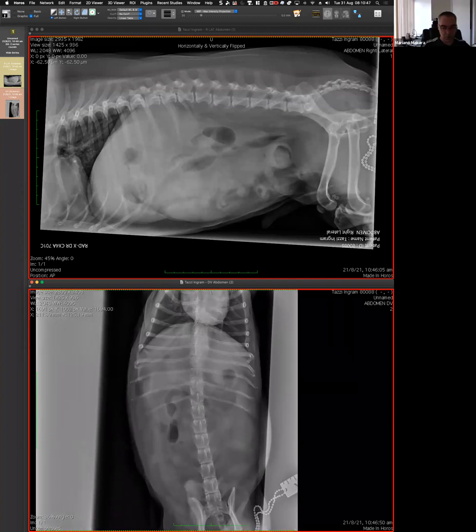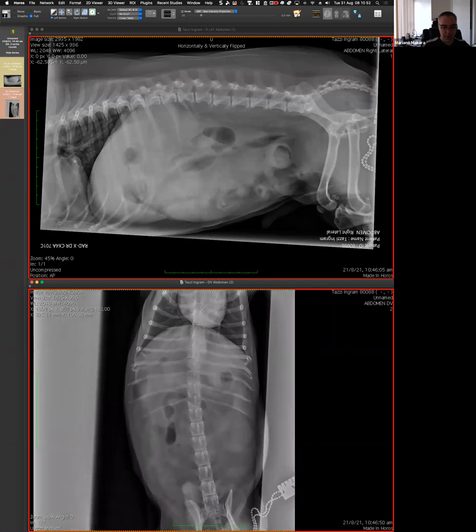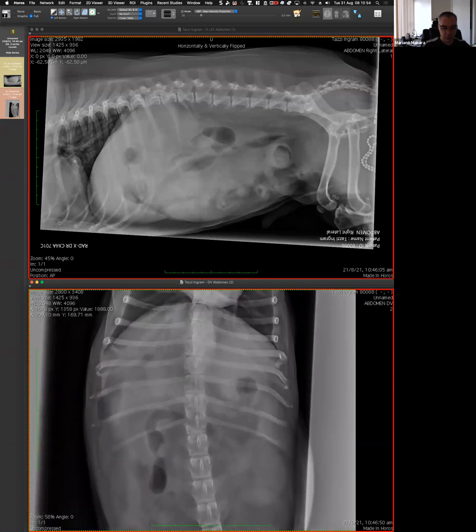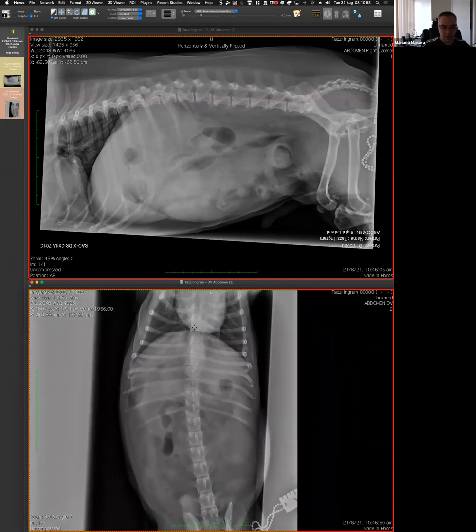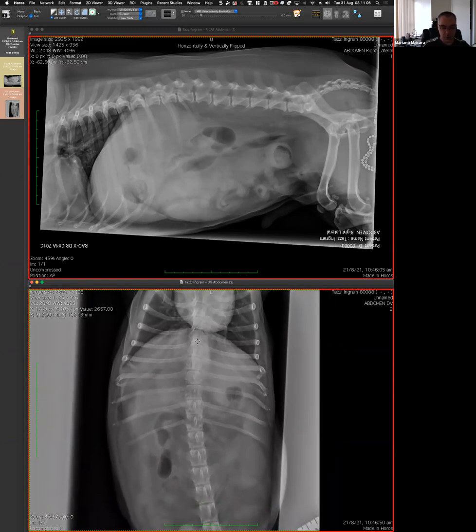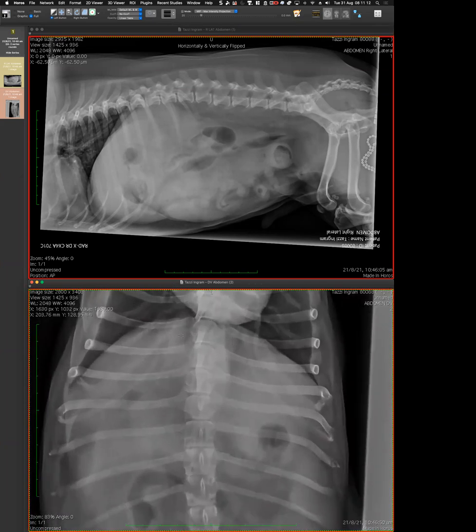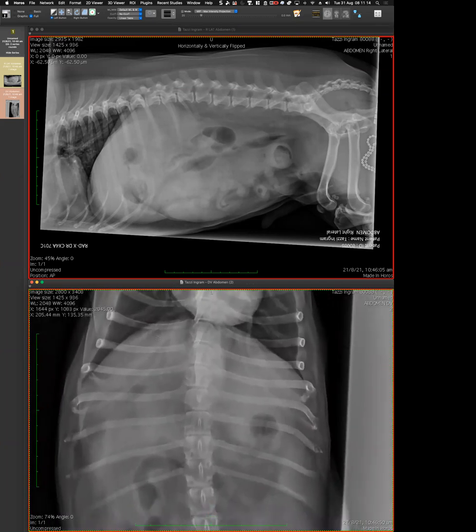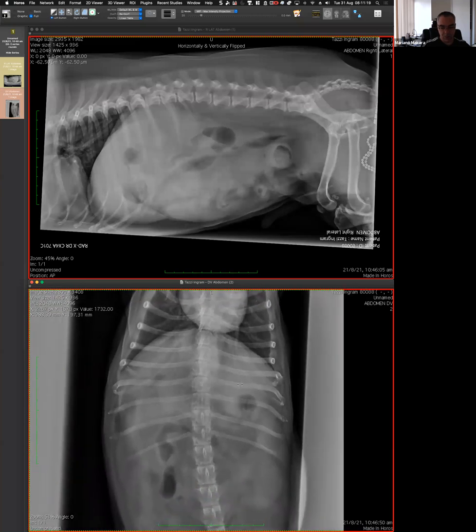Okay, so where can we go when we have a situation like this? In the distal limb, things are so symmetrical that we don't have an anatomical help. But in the abdomen and the thorax, unless there is a congenital abnormality in terms of positioning, like situs inversus or something like this, there are asymmetries that we can rely on. So one of them is the caudal vena cava. I think the caudal vena cava is here and should be to the right. Yeah. And then the other one is the spleen. So the spleen is there.